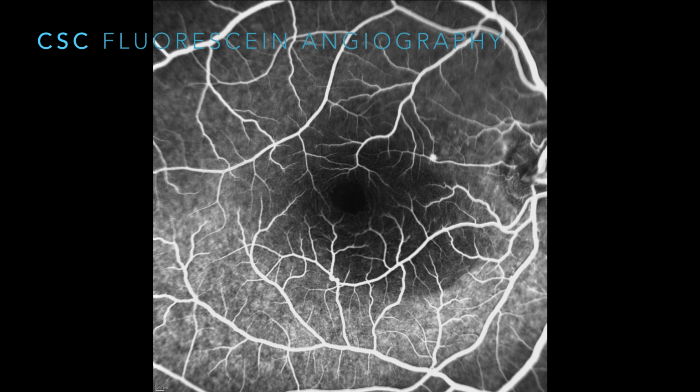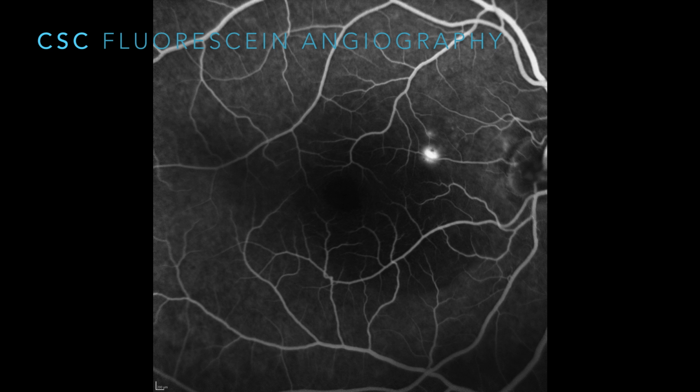Then you see this little white dot between the fovea and the nerve, and then it becomes a little bit larger. It doesn't move anywhere. We call this the expansile dot pattern. And this is the most common pattern you'll see, especially in acute.